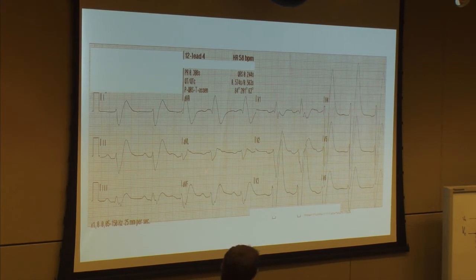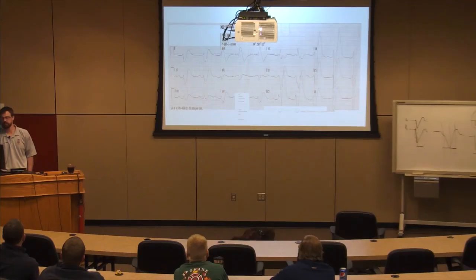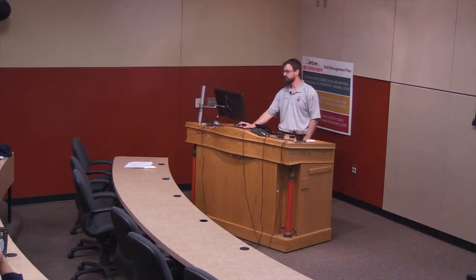So what I got is a bizarre wide complex that doesn't fit left bundle, doesn't fit right bundle. Look at AVR. That's a huge R wave in AVR. That's sodium channel toxicity. Do you know what this one is? A potent sodium channel blocker that's on that list. Digoxin's not a sodium channel blocker. It's in a whole thing by itself. Cocaine.